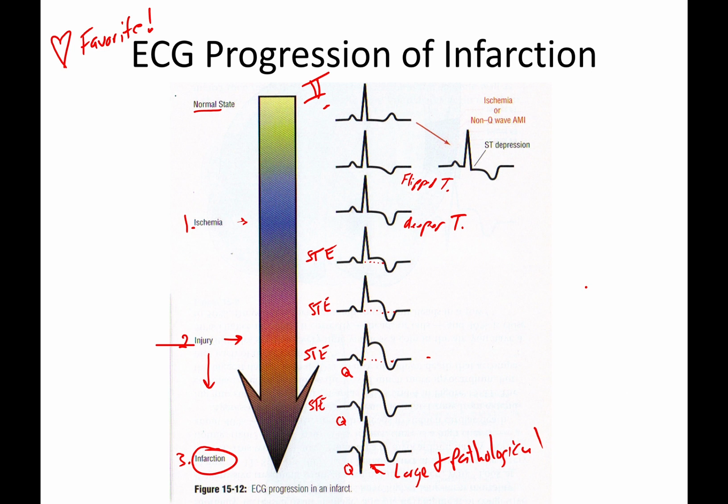That from here, probably through to about here, we'll have reversible changes, because you're just starting to get a Q wave now, but it's tiny, it's early. There's a chance that we can overcome that. And so getting that PCI done will help fix things.